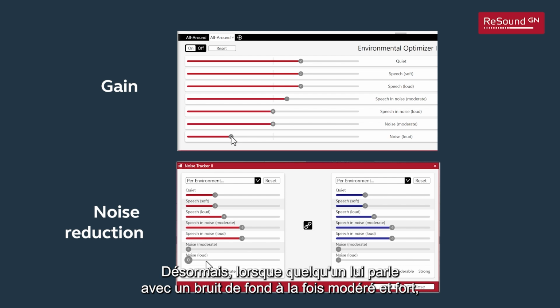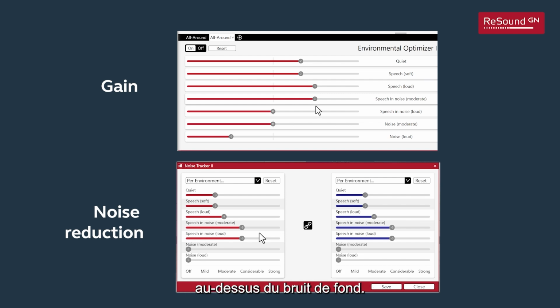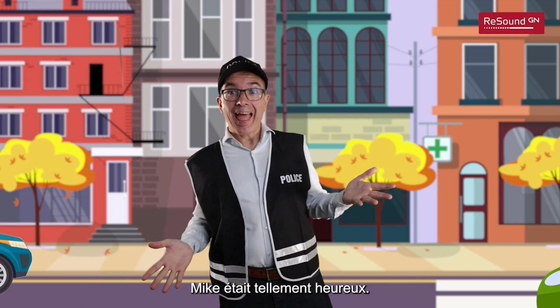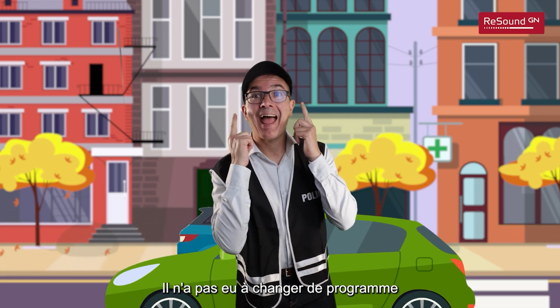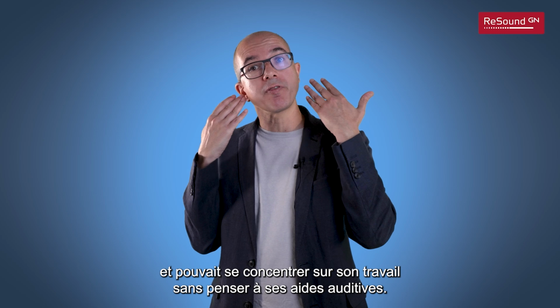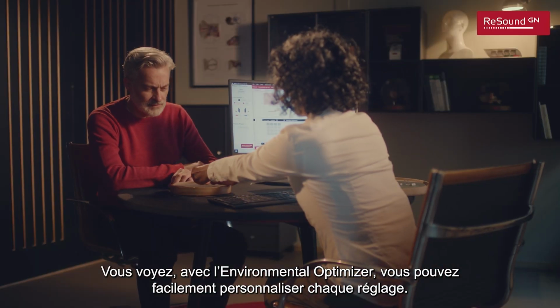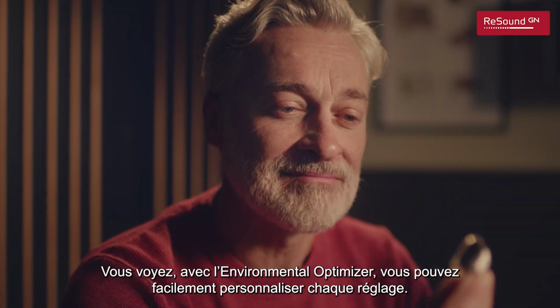Now, when someone talks to him in both moderate and loud noise, I turn the volume up 3 decibels so that the speech sounds distinct above the background noise. And I also set the noise reduction to -6 to attenuate the traffic noise when Mike is talking to someone else. Mike was so happy. He didn't have to change programs back and forth, and instead he could focus on his job without thinking about his hearing aids. You see, with Environmental Optimizer, you can easily personalize every fitting.